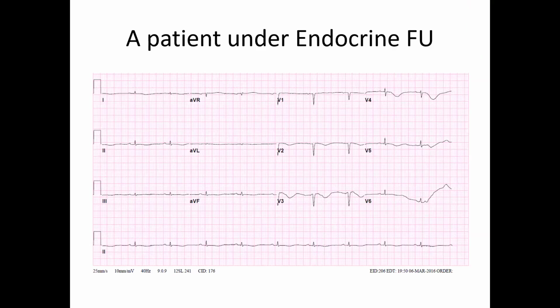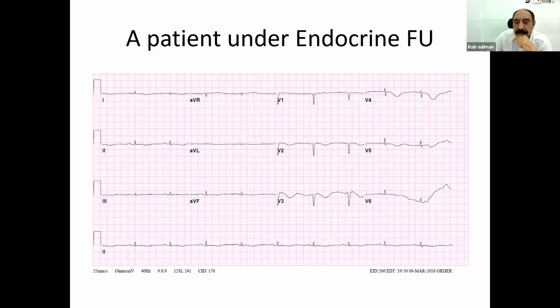So there is bradycardia and it is a low voltage ECG. Excellent. Superb. So there is bradycardia. Especially the limb leads are quite low voltage. And the heart rate is quite brady, maybe like 40 or 40 something. Although it is regular, it is sinus brady. There is also some T wave inversion, also prolongation of the QT, and maybe this is a U wave.